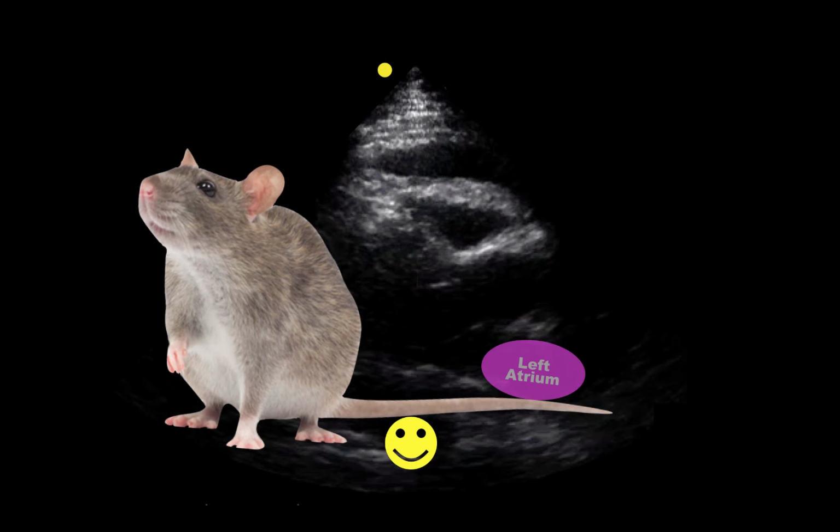I'm from New York City, so we used analogies that involved rats. So this is like a rat tail going between the left atrium and the descending aorta. Well, whatever you want to use is fine. Just remember, something has to go between those two structures to identify that the person has a pericardial effusion.